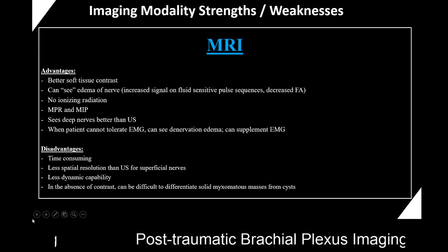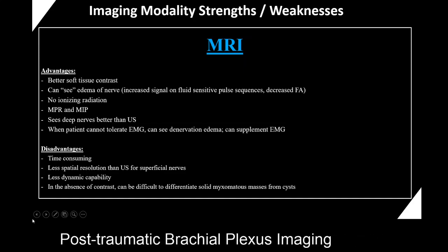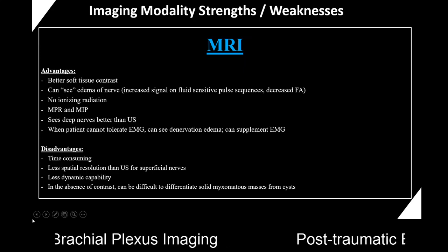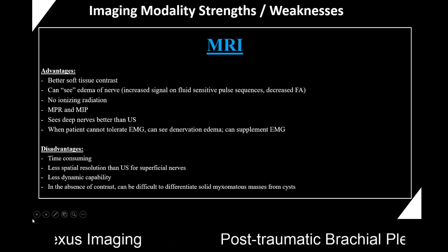There's a sensitivity to different types of artifacts as well. So sensitivity to motion, for example, will really limit our ability to make accurate diagnoses. If there's metal in the field of view, that's going to cause a significant problem as well.